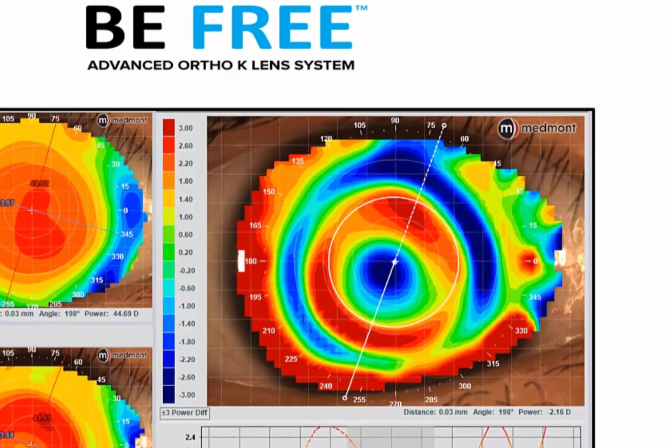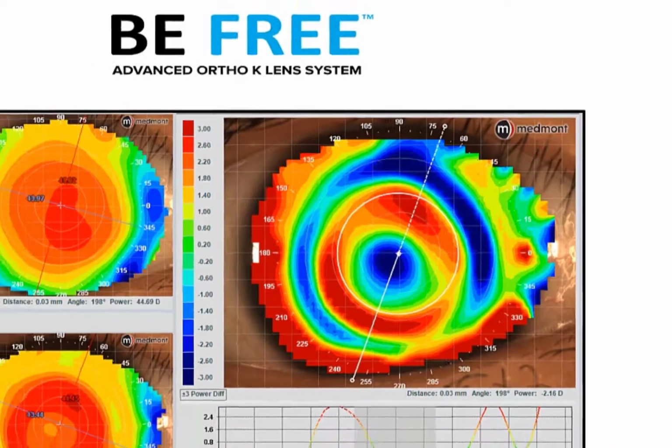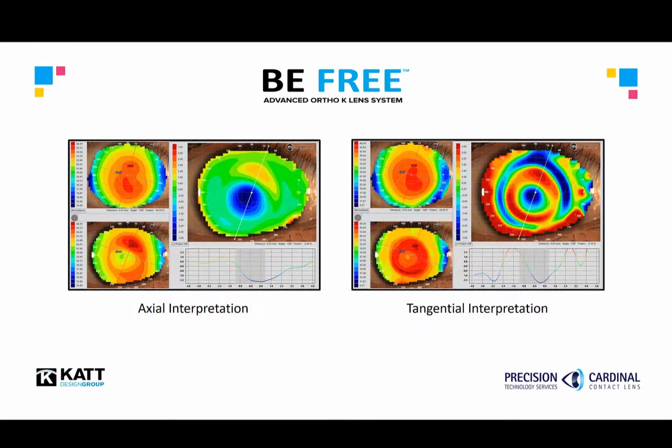Notice the position of the red ring of paracentral steepening that appears low in relationship to the pupil. Both the axial and tangential subtractive maps are suggesting an inferior displacement of the orthokeratology effect. Additionally, this patient had a slight undercorrection. Let's review how simple the BE FREE software makes the process of modifying and ordering new parameters to optimize the fit for the patient.